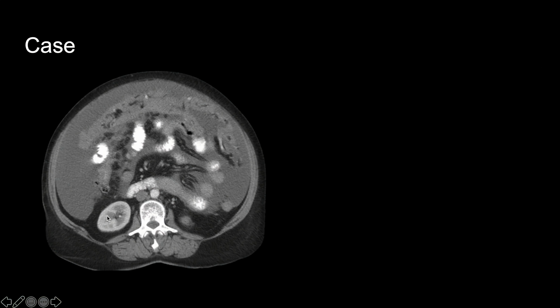This is the kidney back here. This is a retroperitoneal structure. You can see the fluid's not surrounding that because it's intraperitoneal fluid. I'll briefly point out these loops of small bowel that are filled with oral contrast here. And this structure here that has a bunch of fat in it. Remember, fat is very dark. And all of these vessels that are coursing through it. This is the small bowel mesentery here.